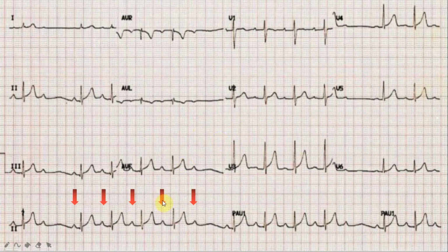So please, if you see Mobitz type 1, sometimes it can be just physiological. In athletic patients, for example, with Mobitz type 1 heart block, you don't have to do anything. But if you see a T wave inversion in aVL, then you need to take it very seriously, and it may be something really not good. It can be a nasty one.